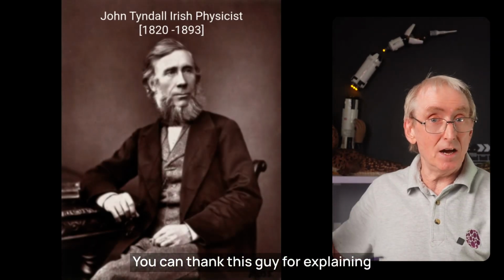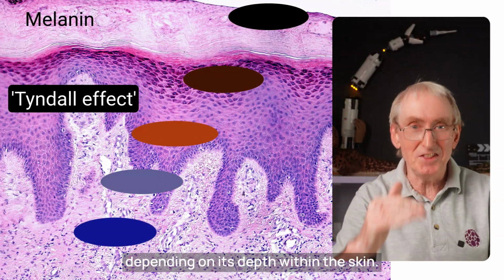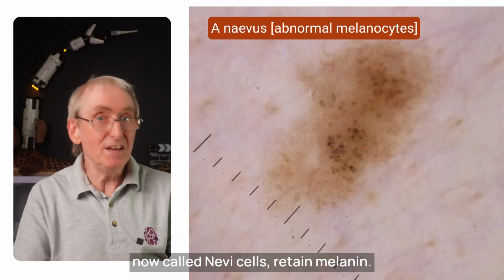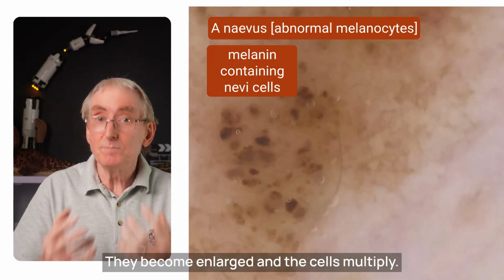You can thank this guy for explaining why the colour of melanin changes depending on its depth within the skin. Let's look at some examples. In moles, which are abnormal melanocytes, now called nevi cells, retain melanin. They become enlarged and the cells multiply.